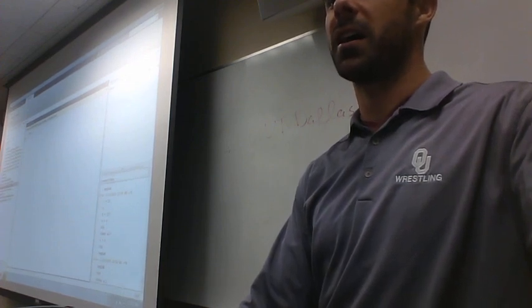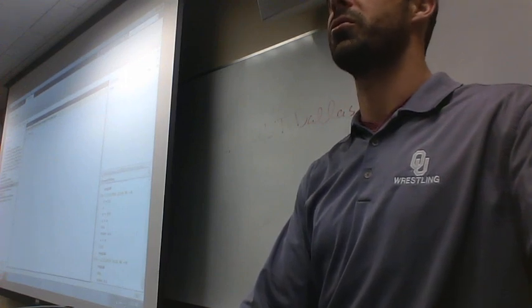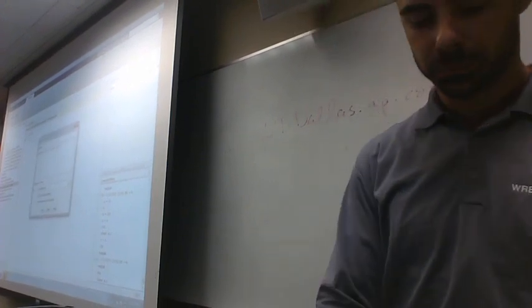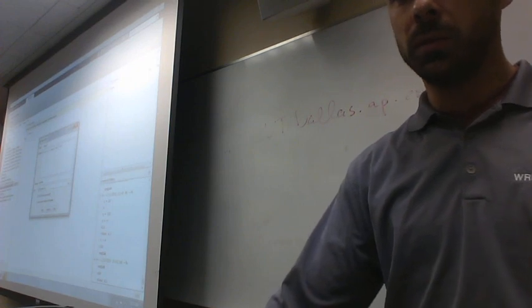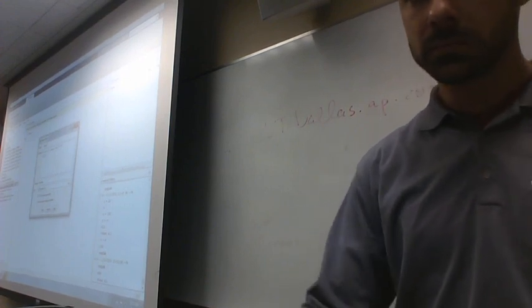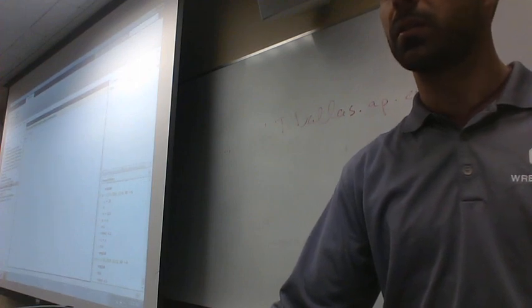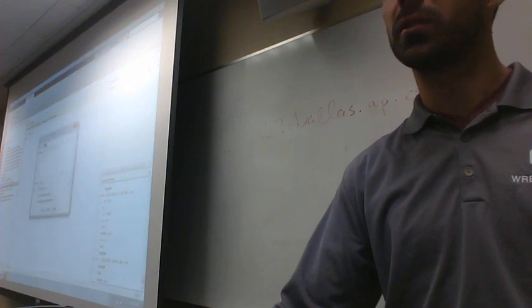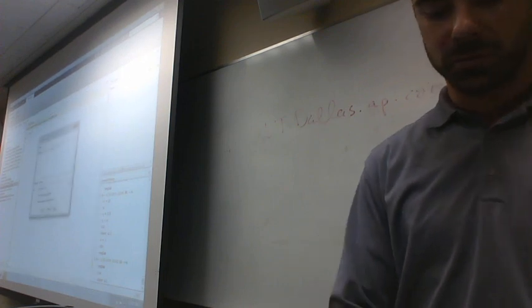All right, why don't you guys go ahead and do that again for clear all and CLC. You can watch me, I'll do it too. I like making them colored, the MATLAB icon, but that's just my call. You can do whatever you want.